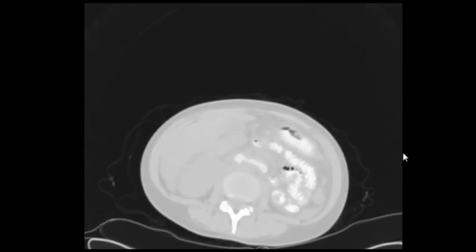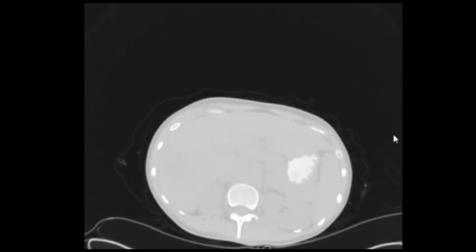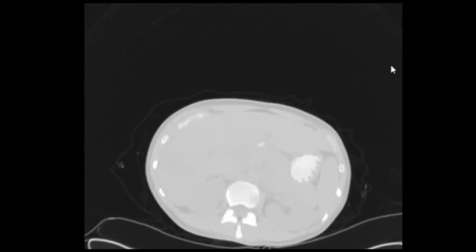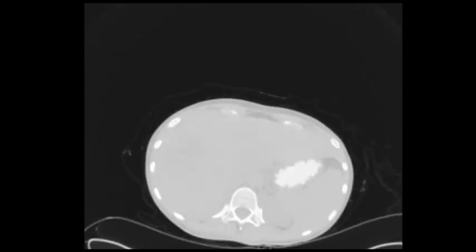I cannot identify any. What are these lines? Are they normal or abnormal? They are ring artifacts, indicating a faulty detector. One of the detectors is not working and is creating these lines.